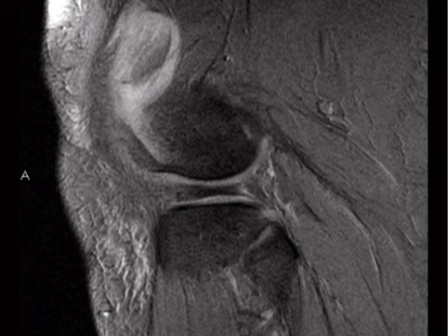I just like it's a good way to learn it for somebody that has no experience and doesn't know what normal looks like. If you get in the habit of counting them, that's probably a good way to look at it. Once you have looked at a few, then you can just tell there's too many, or you can look at the coronal and notice that it's stretching all the way into the notch.